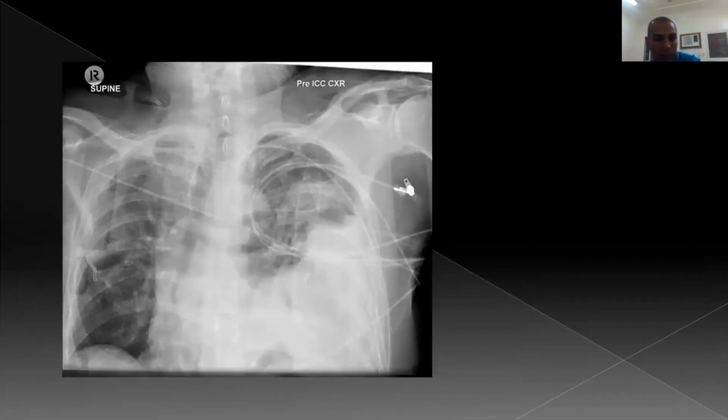We are now still in the second B. Second B includes behind the diaphragm and the diaphragmatic lesions. This one is a road traffic accident, and we will go to the checklist, but I need to concentrate on this point, the left diaphragmatic copula. It looks abnormal.